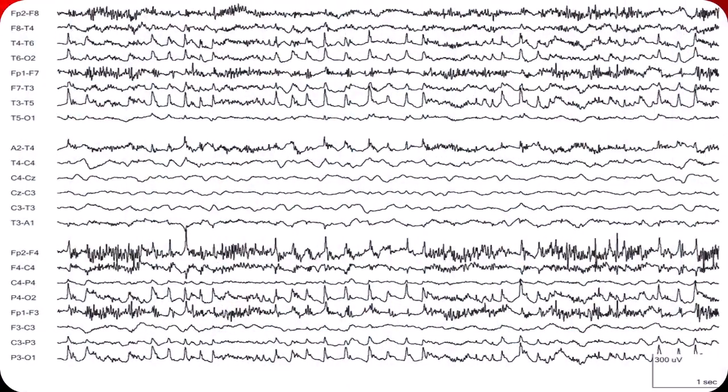This example demonstrates vibration artifact. The waves are short in duration, often triangular in shape, and recur in runs with a fixed interval between them. Some waves appear more complex because faster frequencies are superimposed on the slower waveform. In a clinical setting, this kind of artifact may be produced by an air mattress or another source of rhythmic vibration. The fixed interval is the key clue. When the timing is mechanical and repetitive, the environment should be investigated before considering a cerebral explanation.